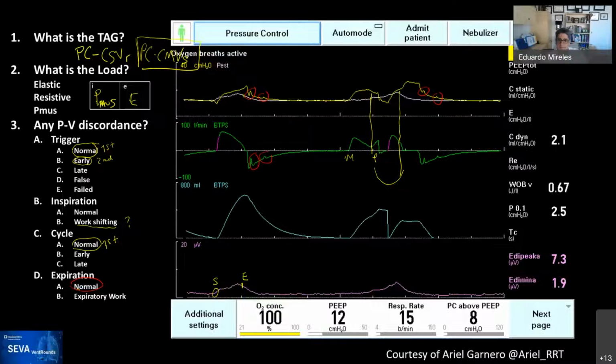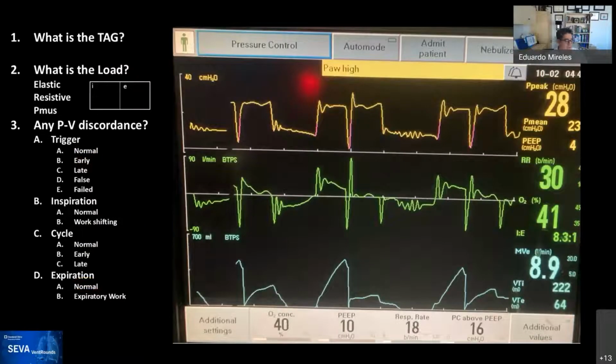All righty. Very good. Okay, we have enough time. So let's do, who wants to do this one? Have no fear. As you see, we're learning. I mean, these are very nice waveforms. They have a lot of information. It can be an RT if they want to jump on. I have no problem with that. Favoring fellows here, being nice.